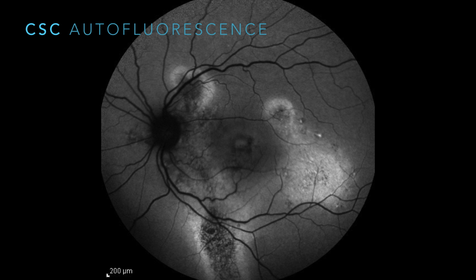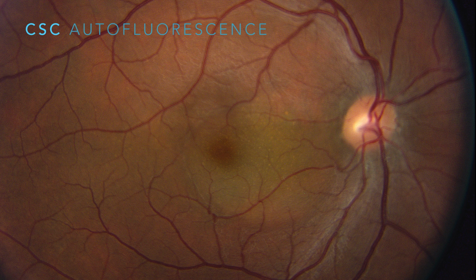You can get a CNV that does this. You can get choroidal hemangioma that can do this. But again, it's not very common with macular degeneration, and it's not very common with most CNV either. So when I see this in a multifocal pattern, the first, second, and third thing I think about are central serous chorioretinopathy. So let's go to a couple others that aren't quite so textbook.